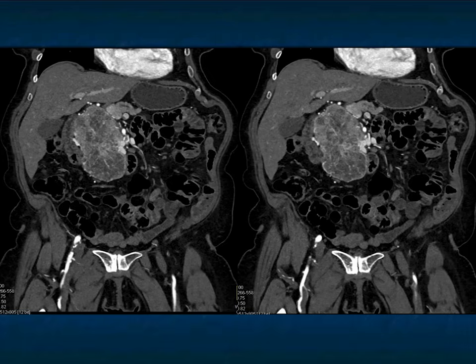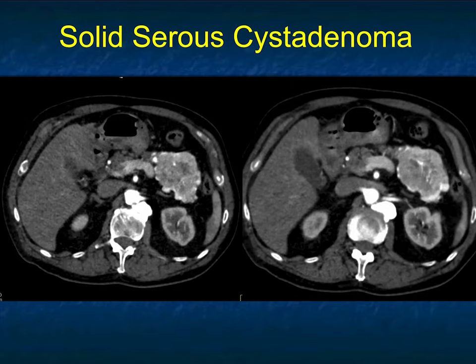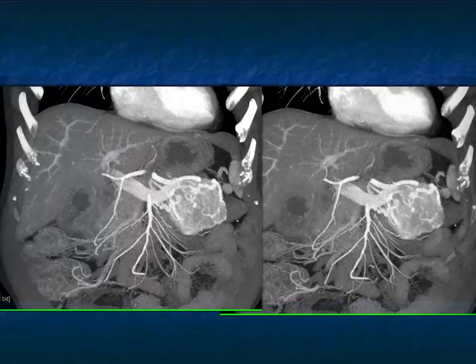And again, here it is on venous. On the venous, the septations, the cysts, I don't think you're going to start going into a neuroendocrine on this case. But this next one, tail of pancreas, again, solid, very vascular. I don't see the cystic spaces I want to see. This was a solid serous cystadenoma, but if you call this a neuroendocrine tumor, I could not argue with you.